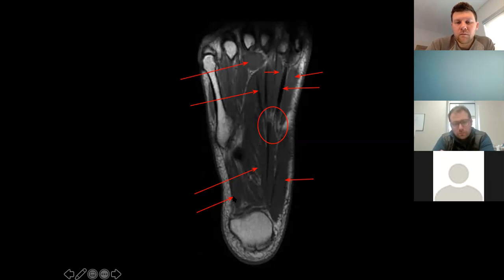If we're already past the second layer or in the second layer, I would say, is that the flexor digiti minimi? So the tricky thing about that is, yeah, this is a hard one. That's why I save that one for last. It could be either or. If it's coming off of the calcaneus. Oh, that's right. Abductor, right? That's right. Yes. So your flexor digiti minimi may be this little muscle belly out here, or that may be a continuation of the abductor, just depending on where everything is. But you wouldn't be expected to identify any of those. It's just more of understanding the anatomy of where everything is. Okay. So good job.